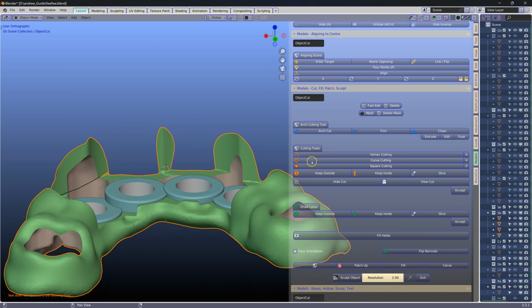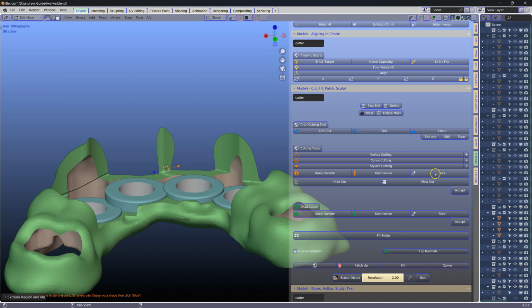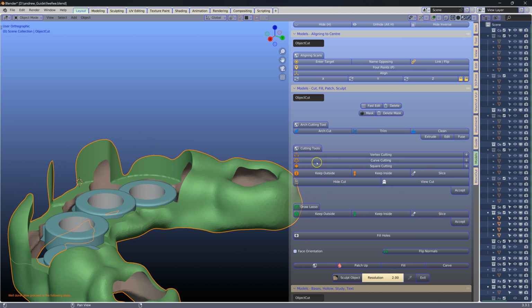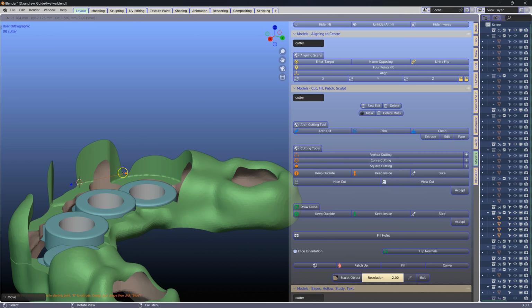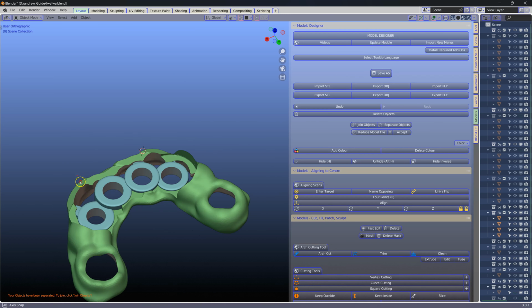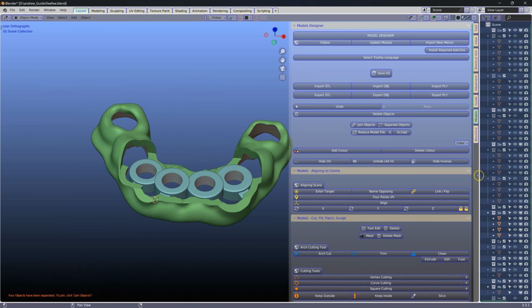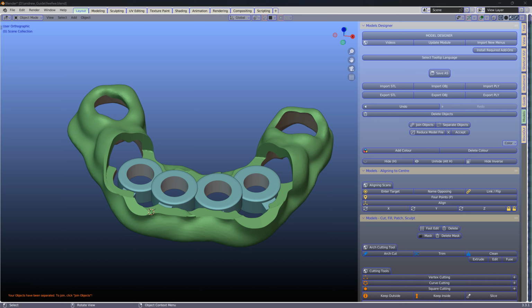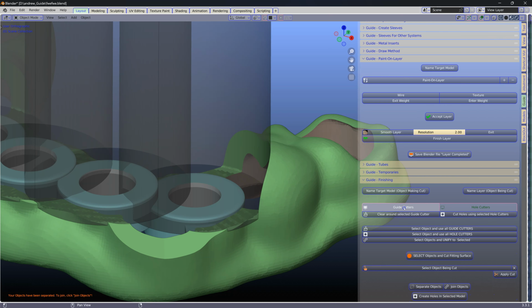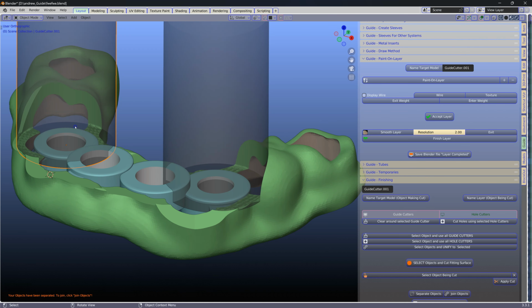Next we're going to do the other few sections and follow exactly the same way to do it. Now how to get rid of them? Separate your object and delete those little bits and pieces. Right in the beginning I told you about the intersections over here. So it can be a good idea to clear those away.